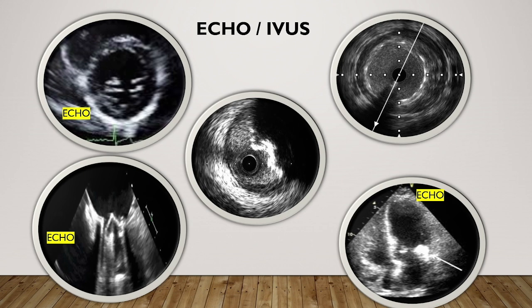These are metals. And if you have calcium like MAC here, mitral valve annular calcium, calcium looks like this in echo. It will not look any different in IVUS. It looks the same. So the principle remains the same.